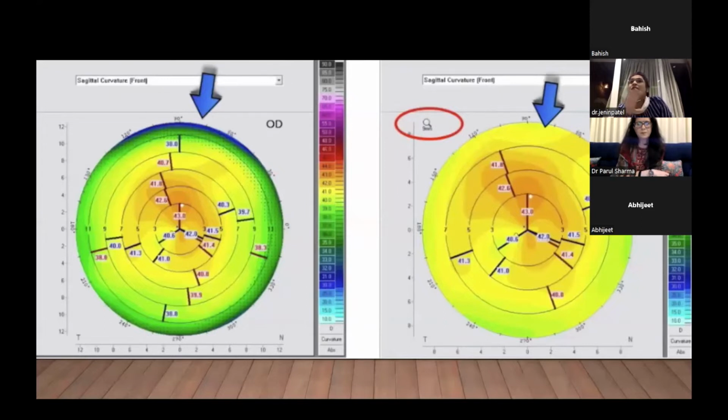No, the minute you have extrapolated data, it's always better to retake the map, because you will not have any percentage like, okay, 10% of this map is extrapolated. It will not be that, because you don't know which data has been extrapolated and analyzed by the computer, and in which way. All it tells us is that some amount of extrapolation is done and it is not a true measure that has been taken. So if we have a lot of extrapolation, the maps taken are not okay and we need to repeat the scan.